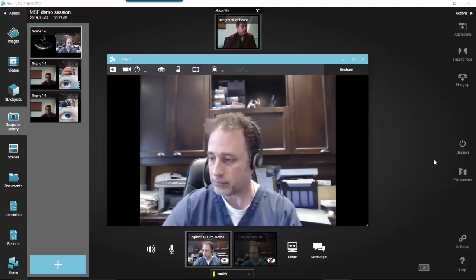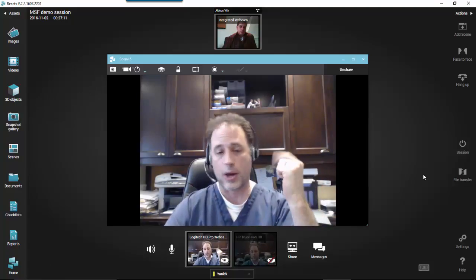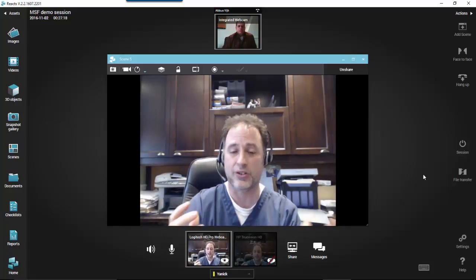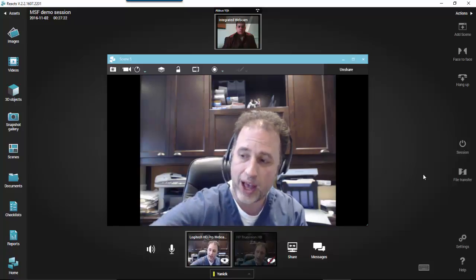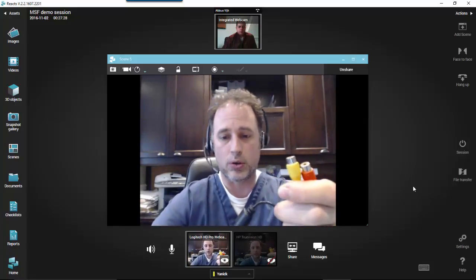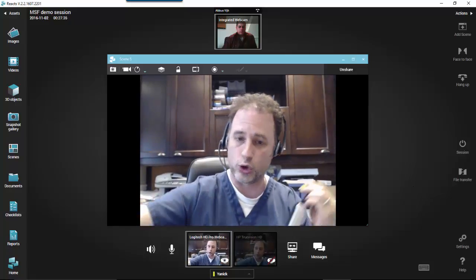So the last thing I want to tell you is that if ever you want to connect an ultrasound machine, a bronchoscope, any type of video, in fact any device with a video output, you will only need a converter. So here I have an example of one called Blue Diamond, where you could connect an RCA cable or an S-video, so whatever has RCA or S-video output, and then it converts the signal into USB.